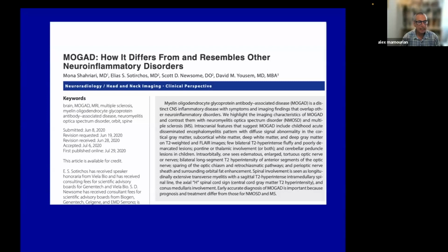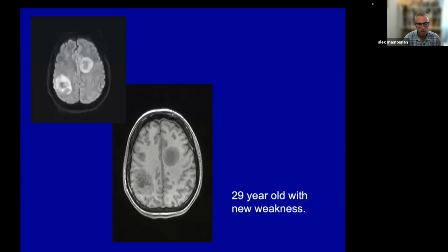disease. So again, if you think you're looking at a patient that is atypical for MS, particularly if it's atypical both clinically and from an imaging point of view, I think you should list this in your differential because specific testing needs to be done to establish the diagnosis.